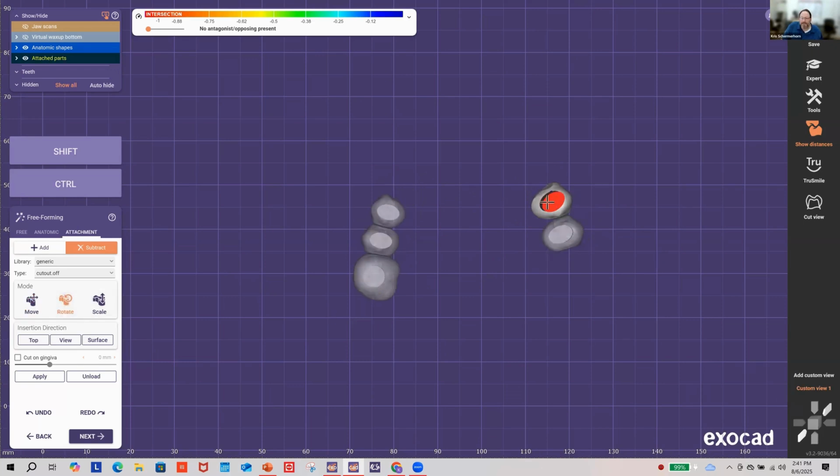Now, the reason that I straighten all these up is because later on, the software is going to ask you to block out the teeth in their sockets. So it's going to ask you to block out the socket the tooth is going to go into, so those teeth will go in and out properly. And of course you want to do that, right? Because there are going to be little undercuts and little deviations. And for dentures and partials and everything, they can be extreme.